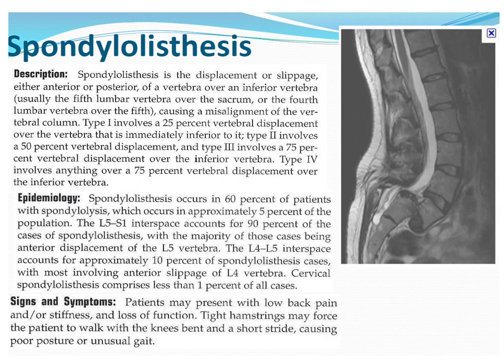And once that happens, then any kind of disc disease that is protruding into the canal, or any hypertrophy of the ligamentum flavum in the back, that's just going to contribute to overall narrowing of the central canal. So that can cause some really significant spinal stenosis, and it almost always causes compression of the nerve roots that are coming out.